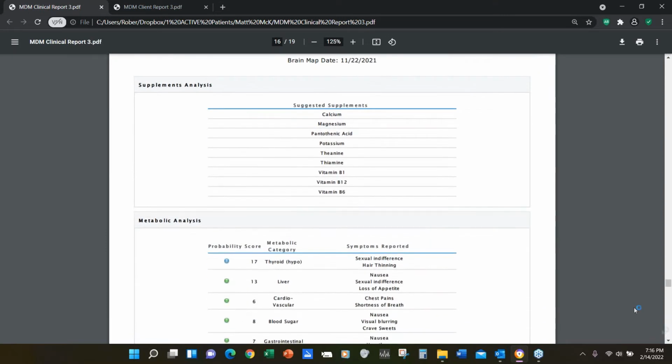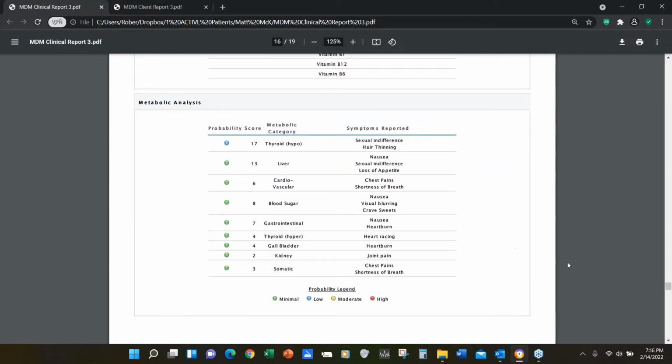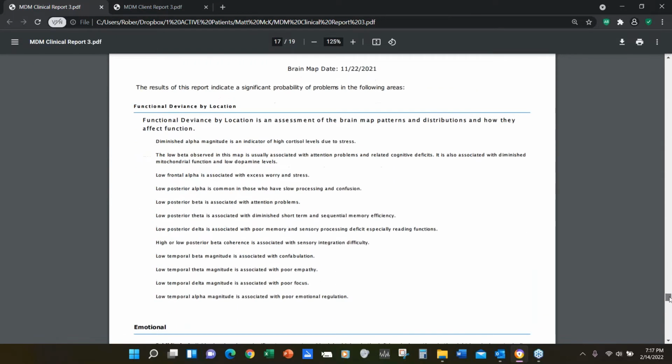And then you have the explanations for all of the things that you see in the dashboard: inhibited, over-arousal, under-arousal, executive processing. These are giving you detailed ways of understanding what's in the map and the various components, with some good explanations. So that's your basic map. Okay, that's all the components of the clinical map, which is what we're looking at here, and the client map, which is the previous one.